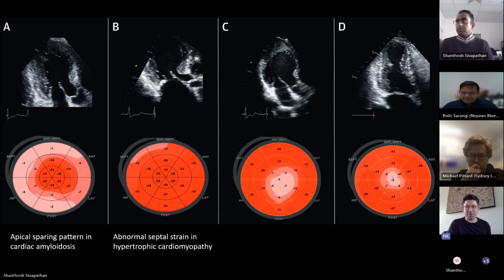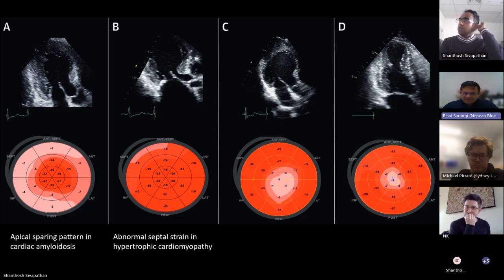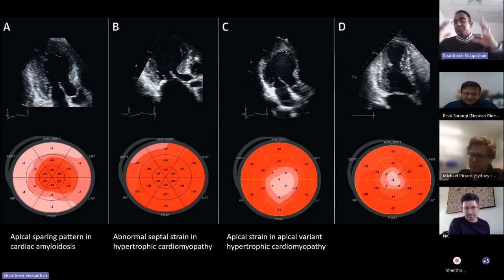Kind of similar to what you talked about with the blueberry on top. Kind of similar, yeah. And the ace-shaped heart chamber, I think. Yes. What is that? Hypertrophic cardiomyopathy apical variant. Yeah, this is a hypertrophic cardiomyopathy, but what kind of variant? Is it apical? Yeah, apical. Apical HCM. So you get this common pattern where the strain is reduced in the apex, but reasonably okay everywhere else. It's pretty hard, not fair, to be honest, but you get this apex where it's a bit more hypertrophied compared to everywhere else. And the last one.